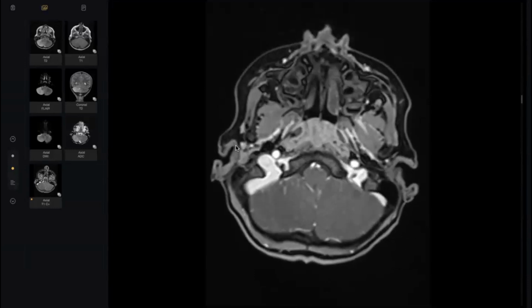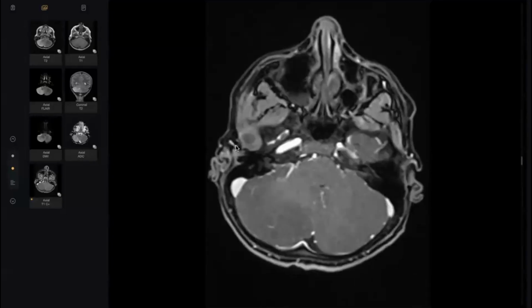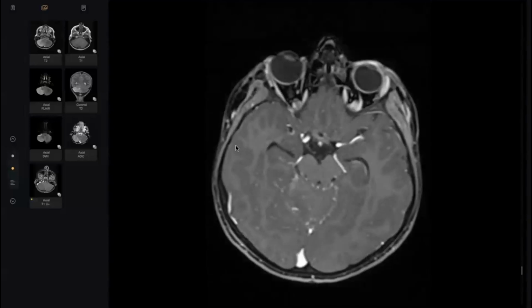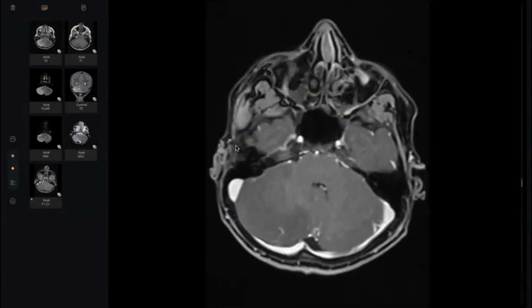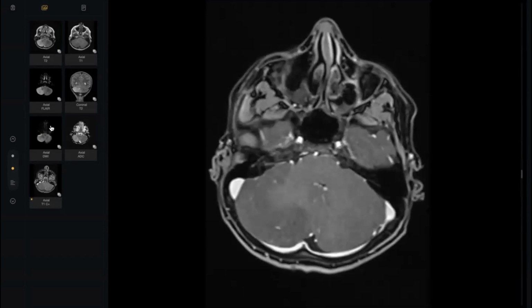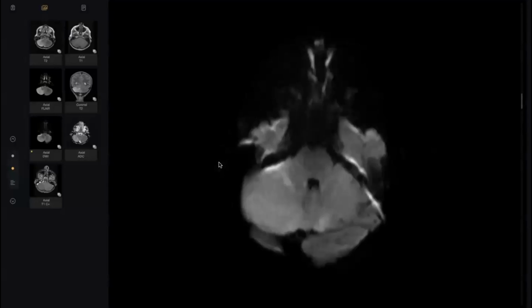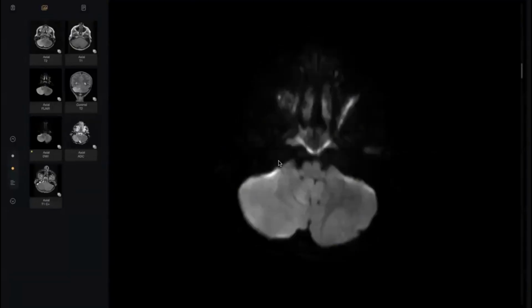What's your diagnosis? Sir, without significant enhancement and involvement of the whole lobe, I am... Remember the history, please. Sir, the history is concerning for some underlying infection, as the patient is having fever. So without any enhancement, what is the name of the pathology here? Infection or inflammation of the cerebellum?